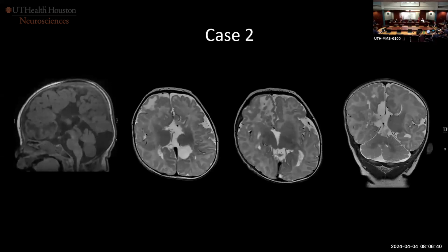This has a little more stuff in it. Try to look for more than one thing.